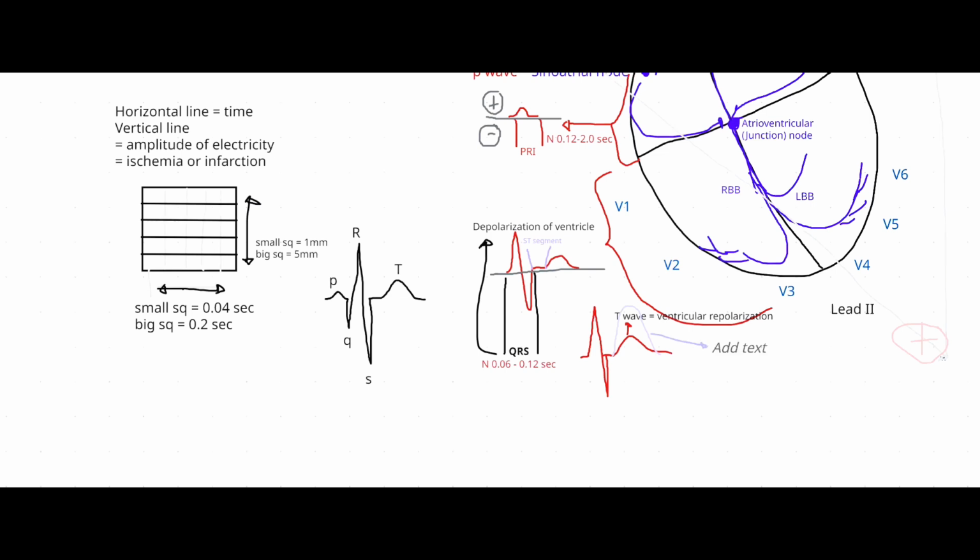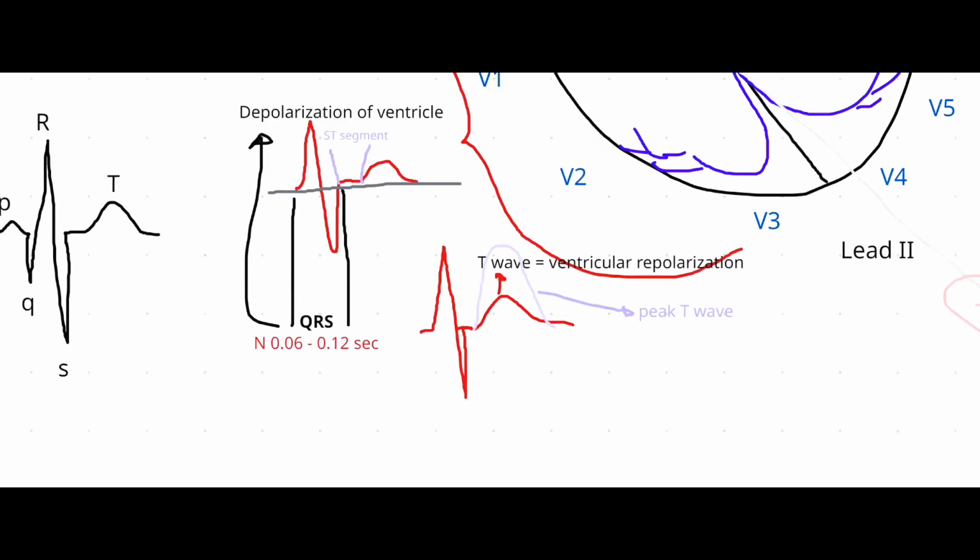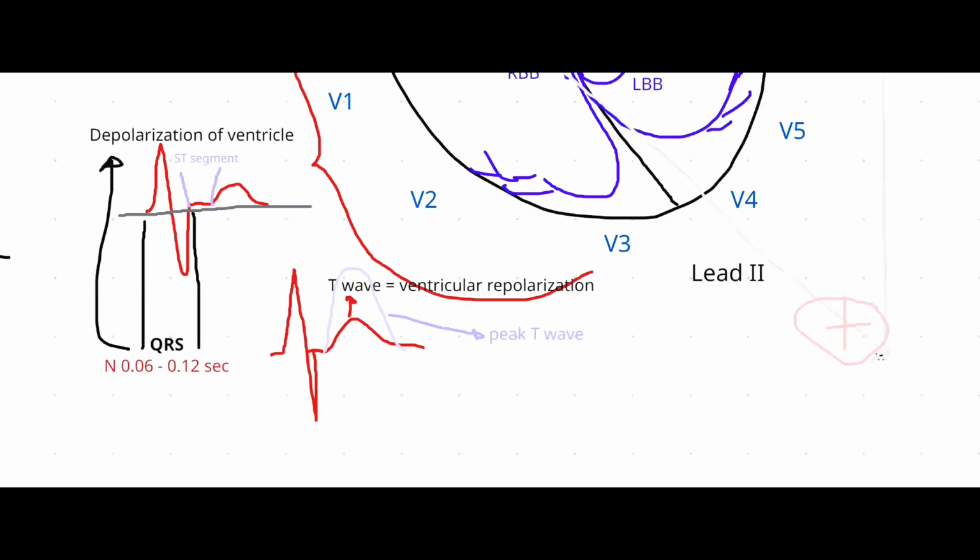It could mean two things, generally two things. You have to look at whether it's diffuse or not. When we say diffuse, that means, are you seeing it locally? Remember how I talked about the leads here, the precordial leads? Or are you seeing it in all the leads? Okay, so if it's diffuse, meaning in all the leads, all the 12 leads, then this is hyperkalemia, right?